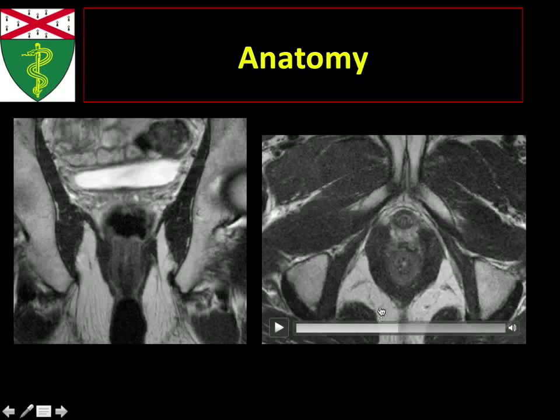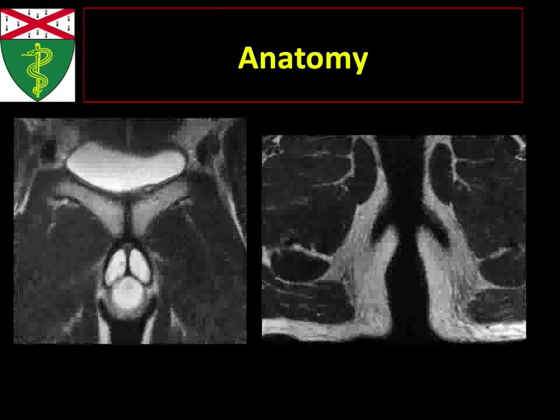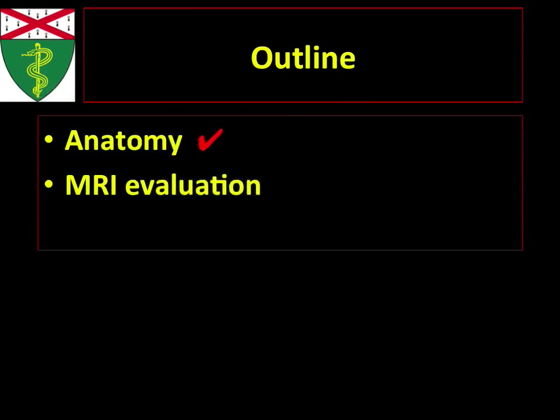And it's very difficult to delineate the rest of the levator plate on axial images. That sound reasonable, guys? Pretty much experts on anatomy now. That's all you need to know. Just know your internal sphincters, know the space in between, and know that there's something called a levator plate that goes higher up. So let's talk about MR evaluation.